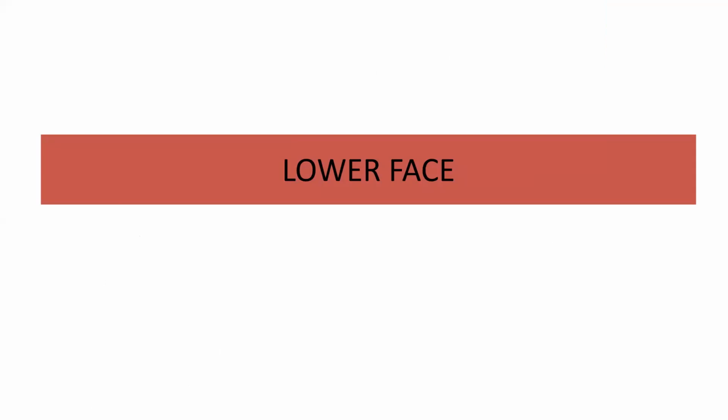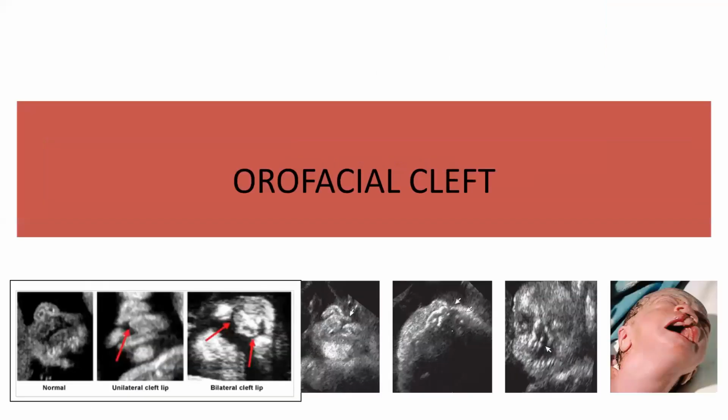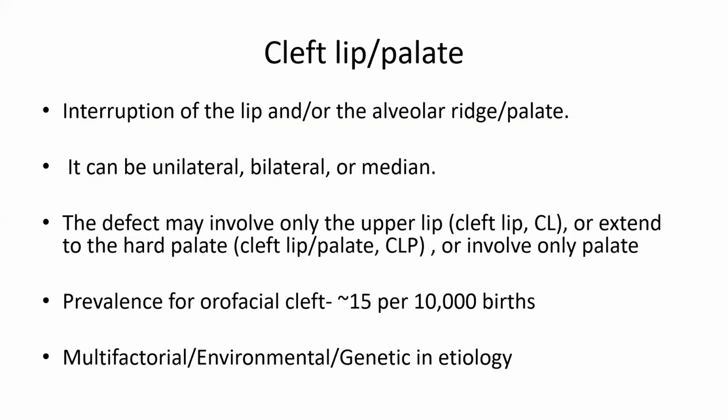Now we will start with the lower face. In that, first, we will discuss orofacial cleft. A cleft is an interruption of the lip or the alveolar ridge and the palate. It can be unilateral, bilateral, or median.